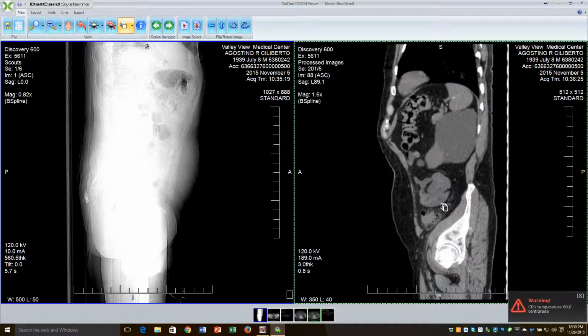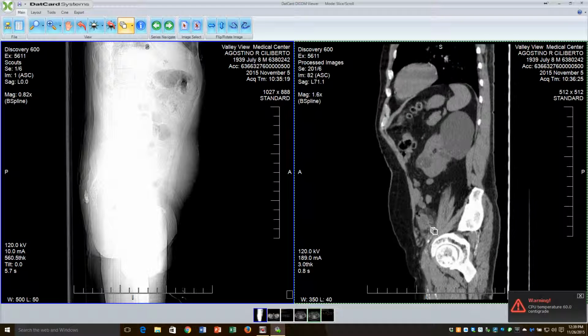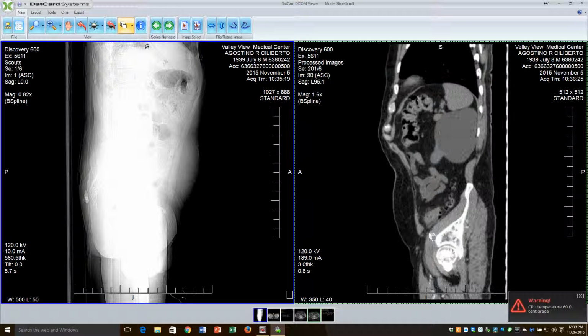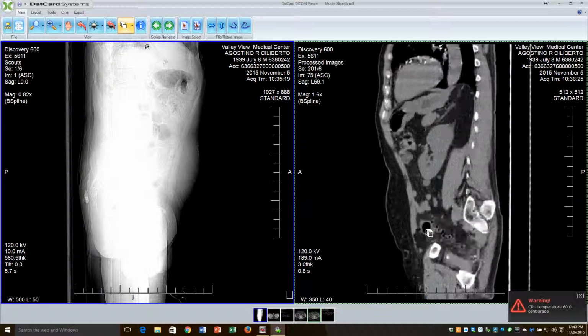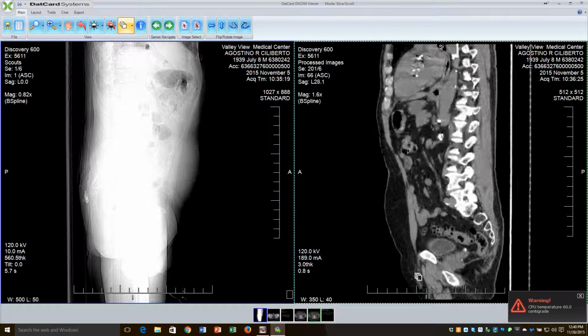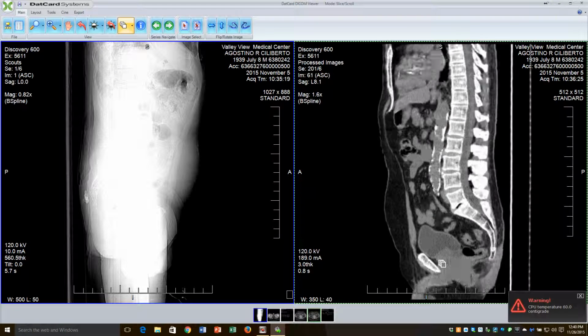And as we move down towards the pubic bone, the haziness in the fat here represents the inflammatory process. So if he hasn't had his colonoscopy, he needs one about 6 weeks after this diverticulitis has resolved. And now let's take a look at the hernias. They don't show up well here. Pretty generous sized prostate gland. This is a pretty good sized gland here. So I wouldn't be surprised if he has problems urinating.